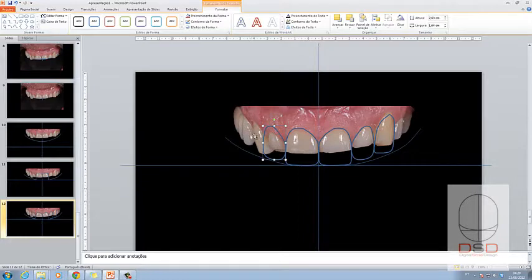So in order for us to simulate that this tooth has the same dimension but is more in perspective, let's say the patient is not going to go through an orthodontic treatment, so we're going to adapt this design by creating the illusion of a rotation. So we're going to say this is an illusion of rotation, and we're going to adapt a little bit here, not so much, maybe here.